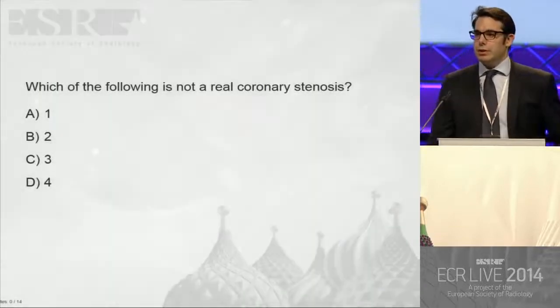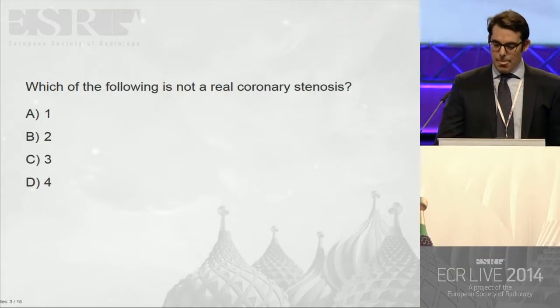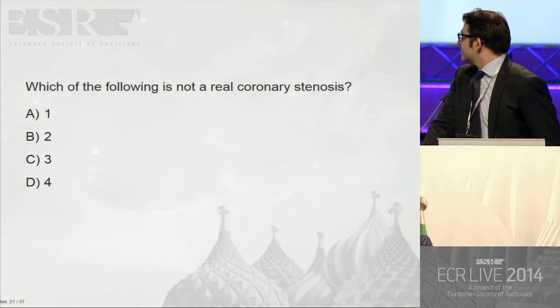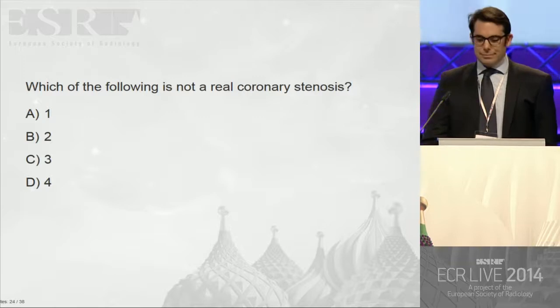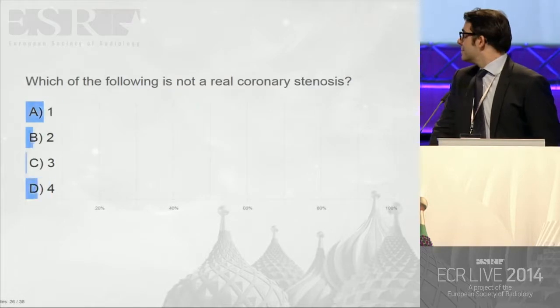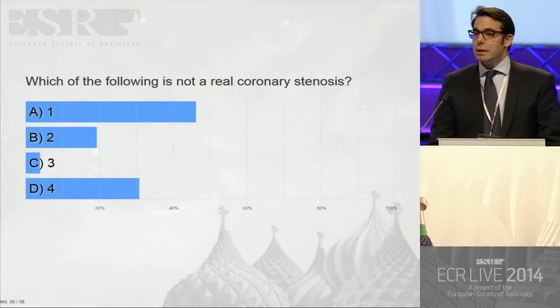Which one of those do you think it's not a real stenosis? Number 1, and I agree with number 1, and I will show you why.